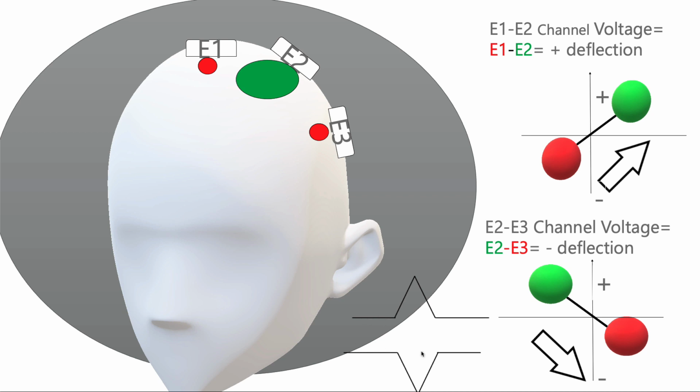This is called a positive polarity discharge here, where you can see you could put a nice plus sign in between this negative deflection and the positive deflection here. When you see the field of it, it has a positive polarity.